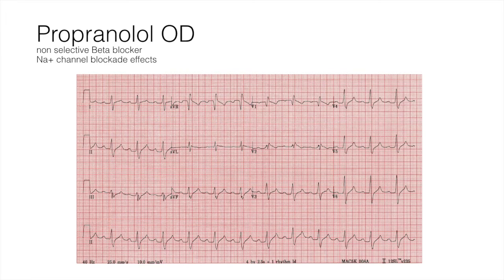This is someone who's going to be at risk for arrhythmias. This is cardiotoxicity manifested on the EKG. And you have the tool to identify that early and make sure that they are not okay for a hallway bed, right? Or okay for the orange zone where I happen to work, right?